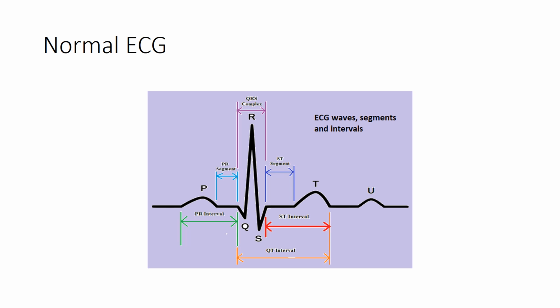A segment is the time or the duration between two waves, whereas any interval in the ECG always includes one or more than one waves.